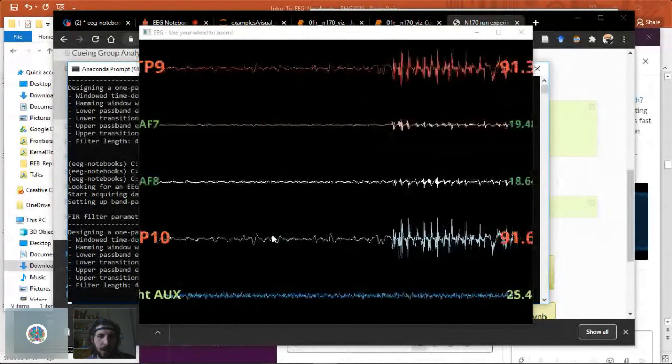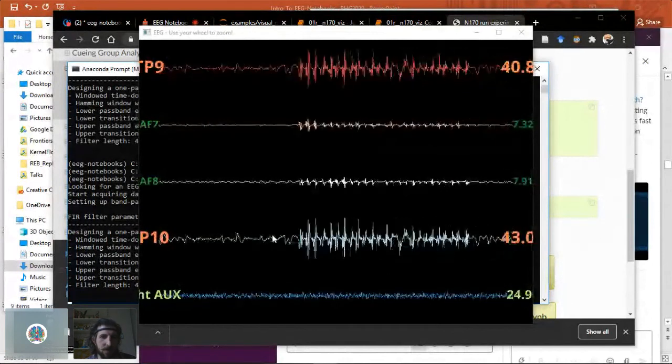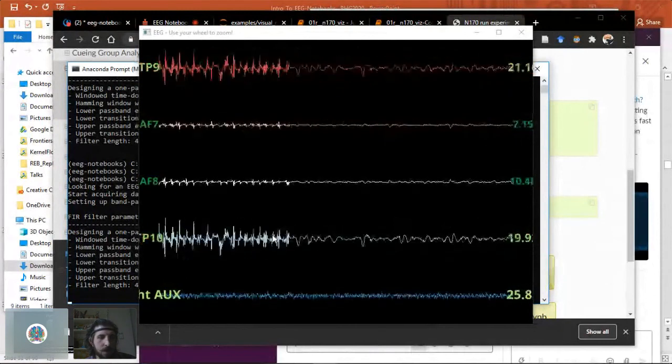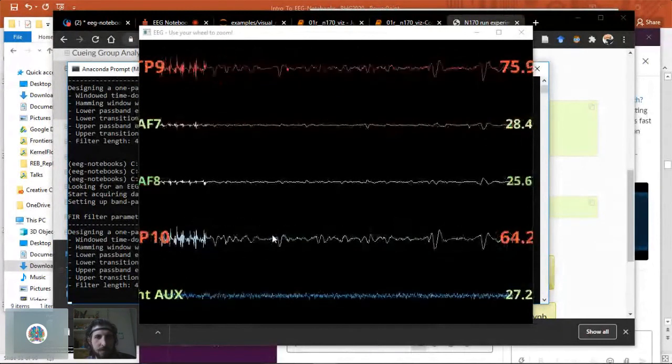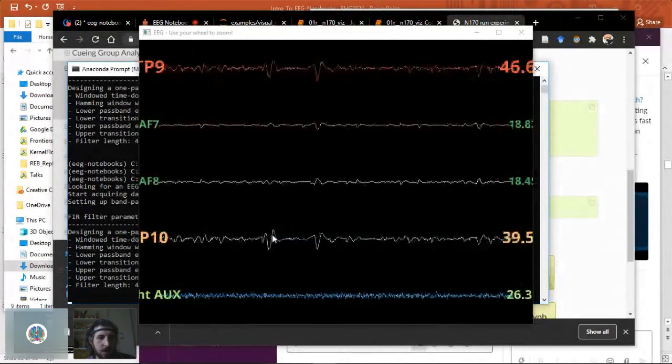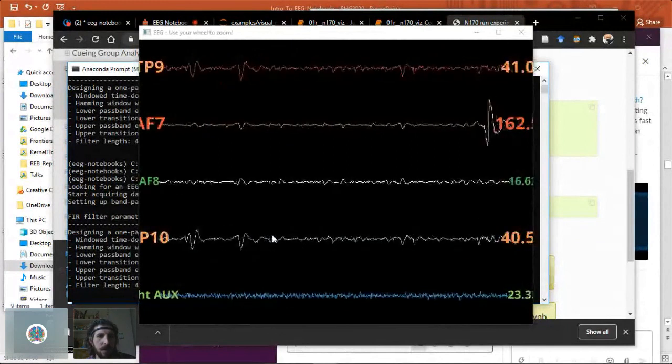Right, that's quite a handy way of checking that your real-time viewer is actually in real time. Because if you do your teeth gnashing and then you only see that noisy component in the signal like 10 seconds later, then you know that you've got a bit of a lag in your viewer, and it's hard to know that otherwise.